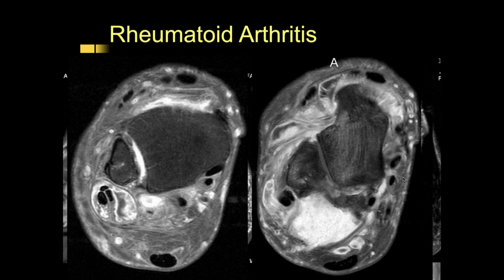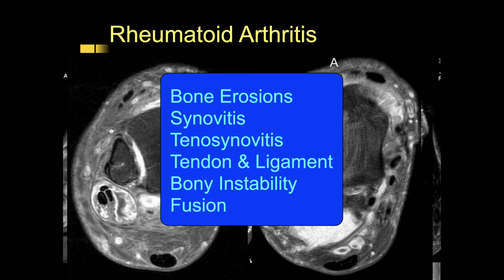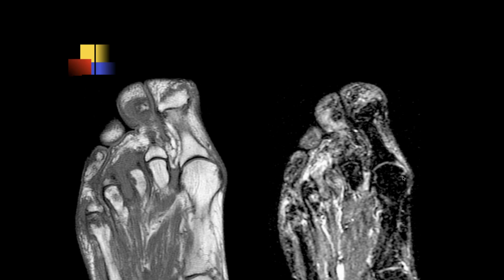And so when you see this much tenosynovitis, you've got to think of an inflammatory arthropathy or some abnormal type of infection. Right, and this was chronic rheumatoid arthritis with extensive tenosynovitis that had gone on to develop an adult acquired flat foot deformity and all the lateral impingement that you saw. Right. So we hope not to see this anymore, since this can all be treated before.